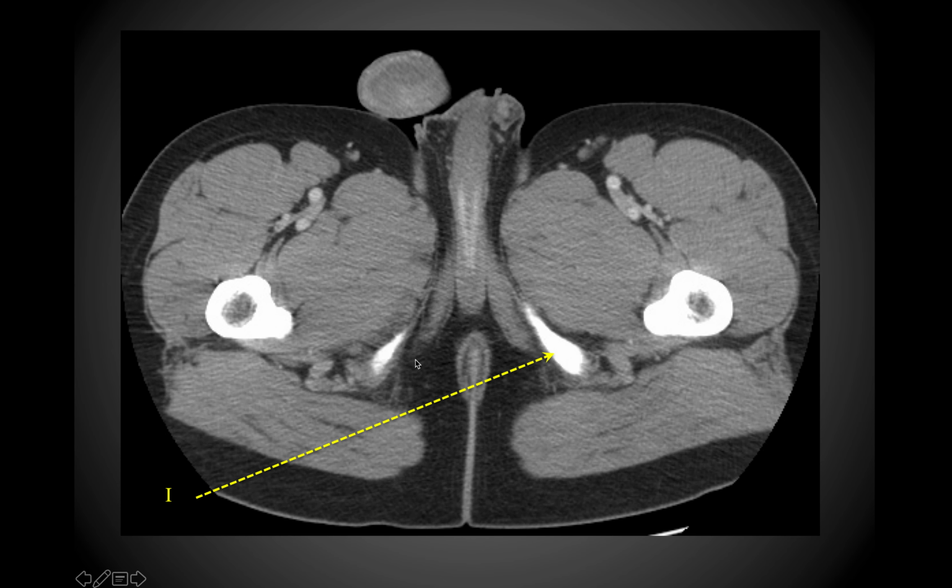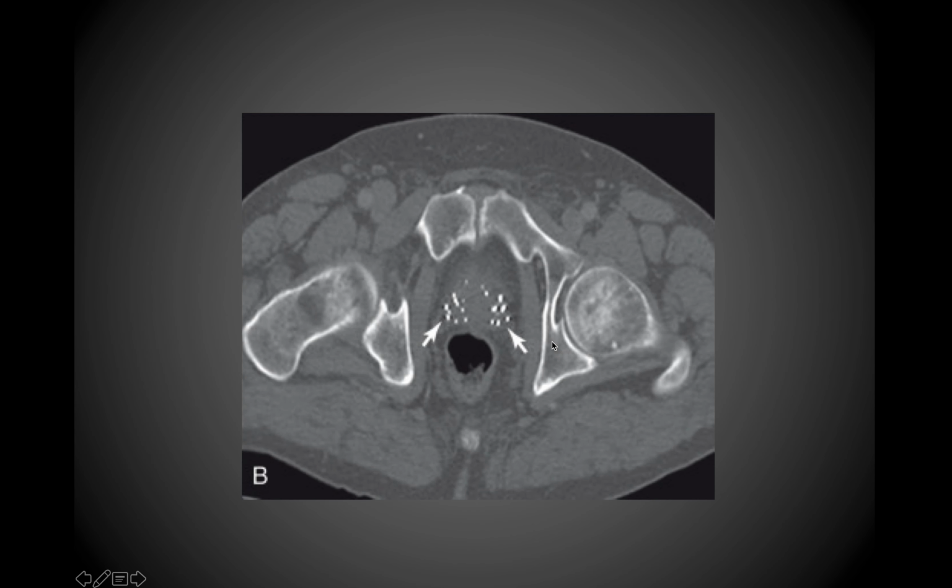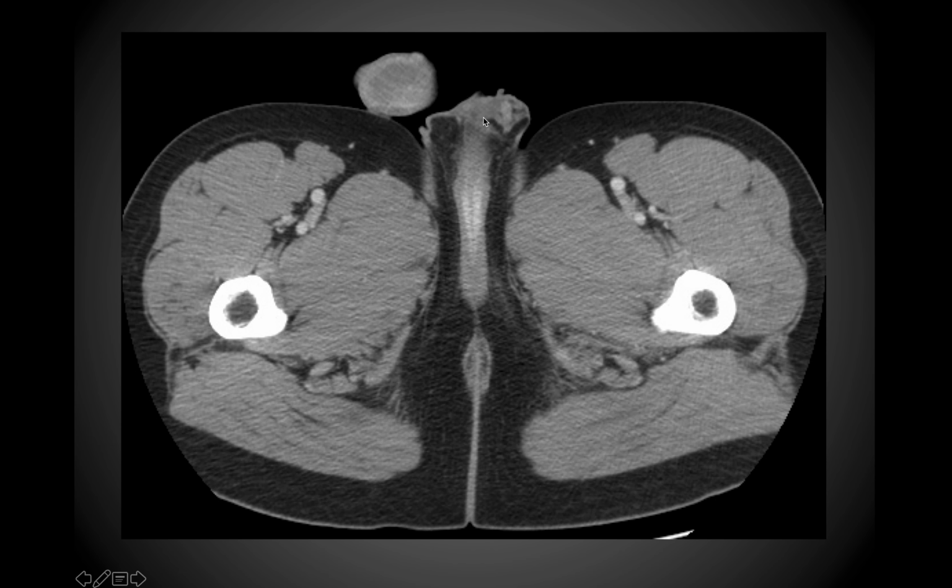Then as we continue descending, once again we can see the ischium, and eventually we would hit the scrotum, though we're just now approaching that location in this individual. So this is getting towards the distal tip of the penis around the glans.